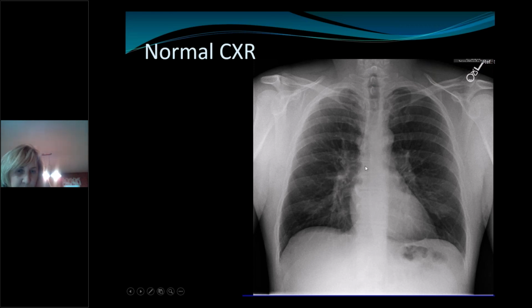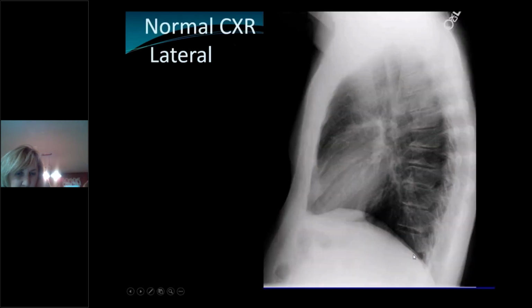You see how it's a little lighter down here? As we follow the trachea up, right here we can see where it breaks off into the right main stem bronchus. The trachea is a little bit darker because it's air-filled. So we see it here, here, here coming down, and about right here is where it's going to split, again right main stem and then left. Just some things you want to be able to look at and have a pretty good understanding of. And of course, there is a little gas bubble down on this person.